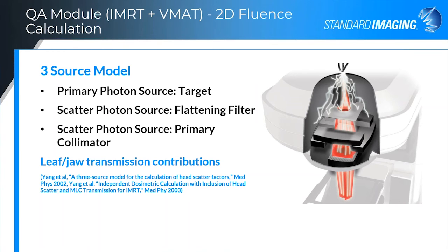So next, moving on to the QA module, where one would do calculations for IMRT and VMAT plans.